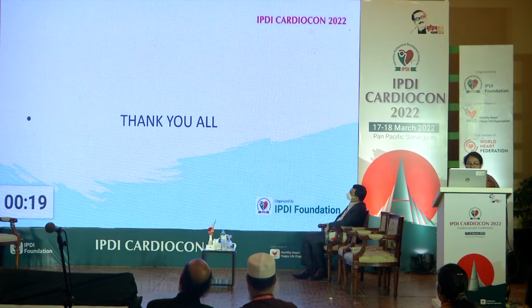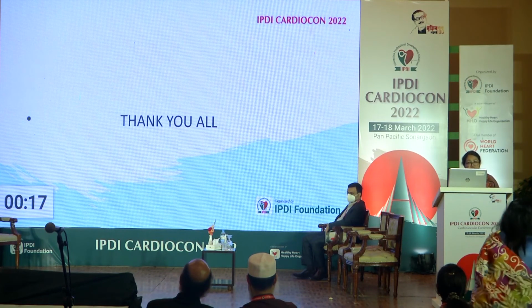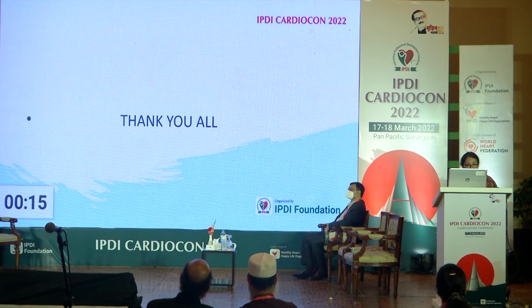So identification of pulmonary veins on echocardiography is not a luxury nor a waste of time. With proper evaluation, we can identify all the pulmonary veins and therefore any abnormality if present.